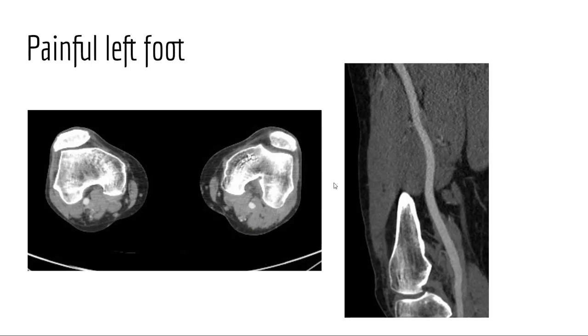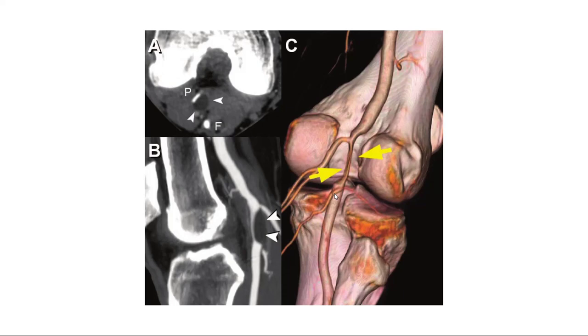This is one of those cases, actually, where every single slice of the image matters. It's unfortunate because there are 1,800 images sometimes with these CT runoffs. And in this case, I believe only 2 images on the axial demonstrated this narrowing. I can't even really see it on this curve reformat. It's somewhere around here. It's not very convincing, but I think with dynamic imaging, it would be even more convincing if we had access to a dynamic ultrasound. So not everything is peripheral vascular disease.